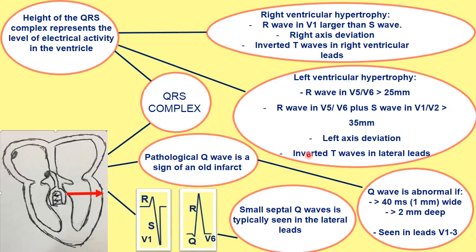Also, we talked about the inverted T waves. If depolarization is abnormal, repolarization tends to be abnormal as well. And from my last video, the normal duration of the QRS complex is less than 120 milliseconds. You can watch my old video to see the factors that could affect QRS duration. Why could the QRS complex be wide?